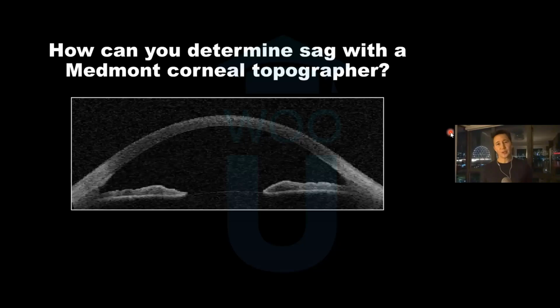So could you use the topographer to help you along this path when the Medmont is a corneal topographer, not a corneal scleral topographer? Well, the Medmont does an awesome job of measuring corneal sagittal depth.